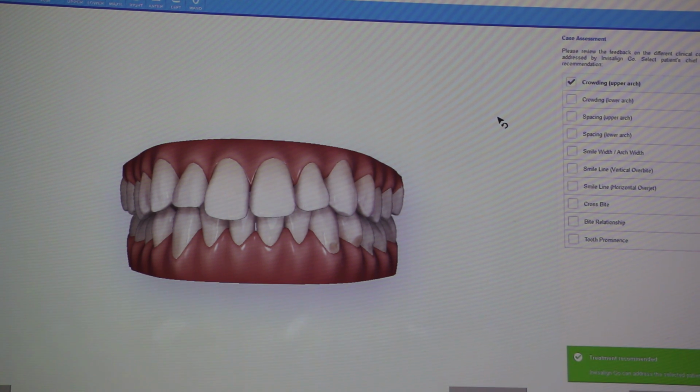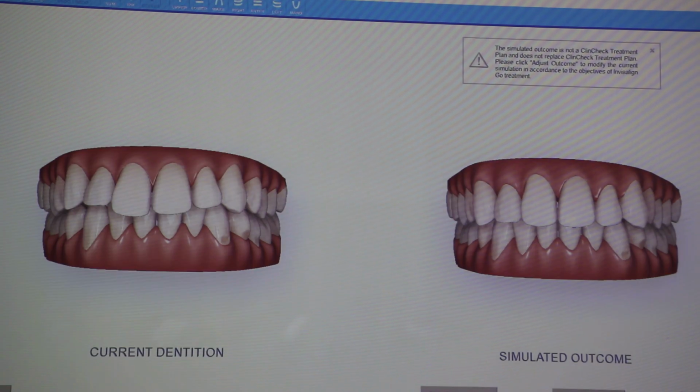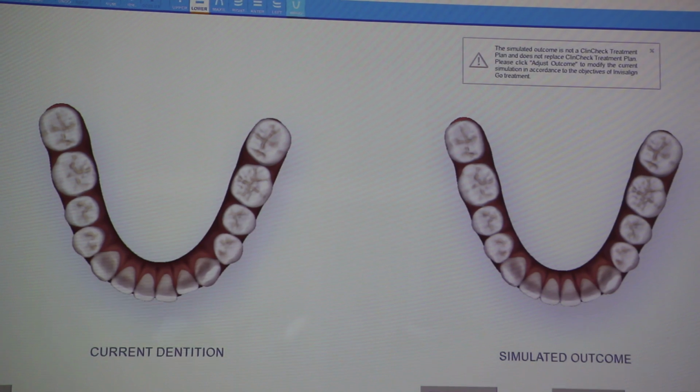Remember the two most common questions, right? How long and how much? You got to know how much, because Dr. Pope's going to tell you, or whoever you decide your fee structure, and you'll be able to tell them how long, because remember, this is all 20 weeks or less, right? From here, being able to show everything you can do, the other cool part is you can immediately and instantaneously go to the simulation. So you can show the patient what's changed, and hey, this little tooth right here that you were concerned about, this is what it's going to look like.